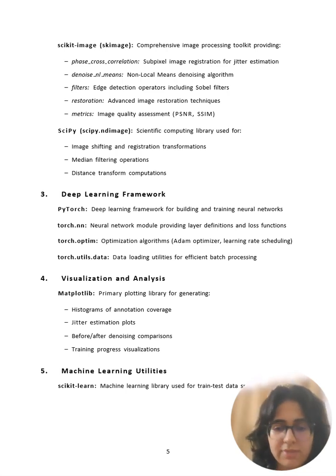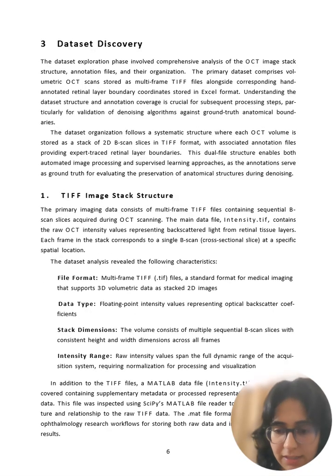So it is important to validate what we are doing. For that, we are using scikit-learn to split the data as training and testing data. So dataset exploration involves analysis of the image stack structure, annotation files, and their organization.